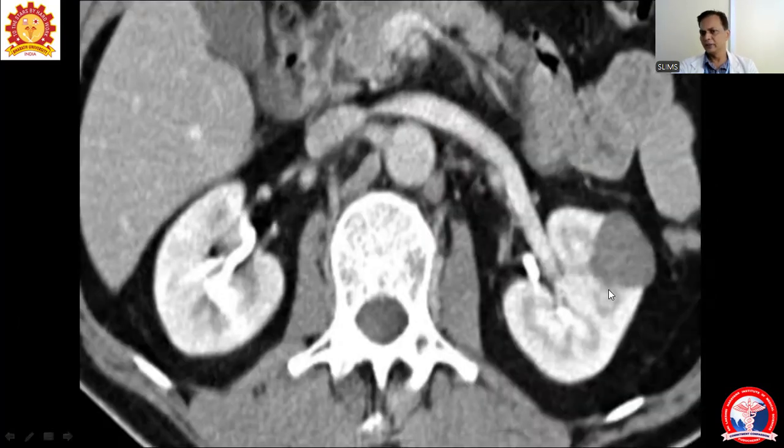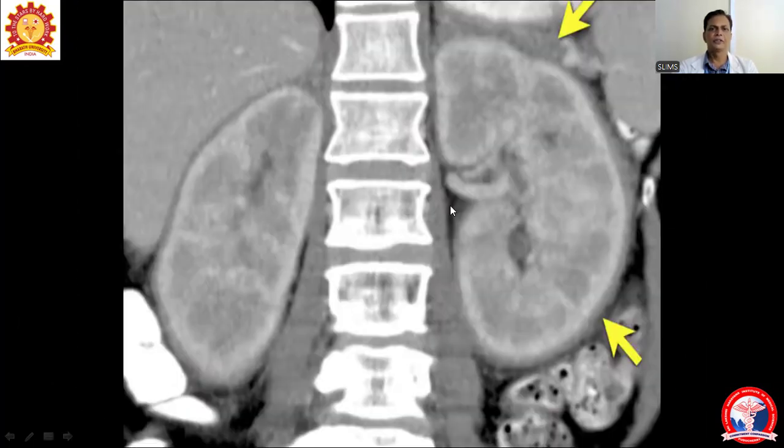Here, again, renal carcinoma. This is the papillary type of renal carcinoma. Here, this is another entity. Here we are seeing both kidneys showing enlargement. By and large, the maximum size of a kidney is less than three to 3.5 lumbar vertebrae.